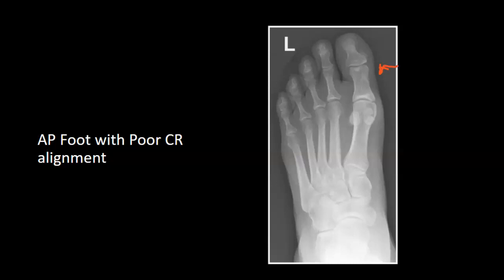Your joint spaces between the tarsometatarsals will be closed, and the joint spaces between the navicular and cuneiforms will be closed. So this causes a repeat. Make sure you put on an axial angulation central ray for an AP axial foot.